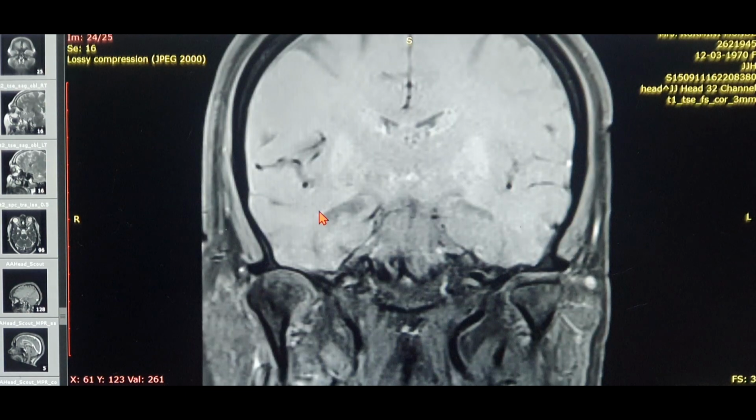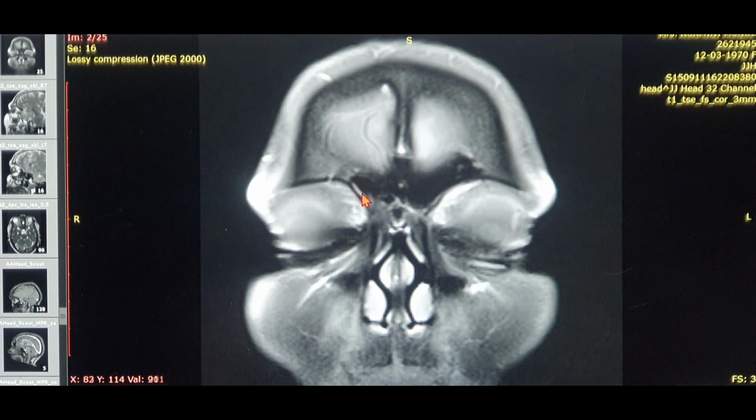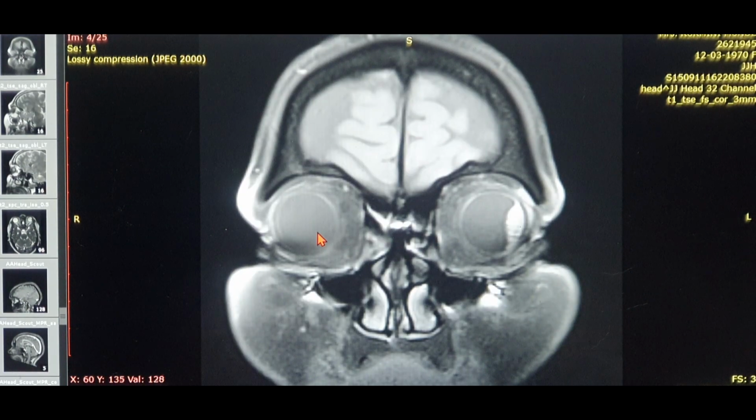So that's the frontal sinus. On the left side, it's a huge frontal sinus. That's the right frontal, that's the left frontal. These are the nasal turbinates, which are going to have a bright appearance. This is the eyeball, that's the globe. If you keep on going behind, you're going to start seeing the frontal lobe, the 2 cerebral hemispheres. The middle turbinate is appearing in the picture right now.